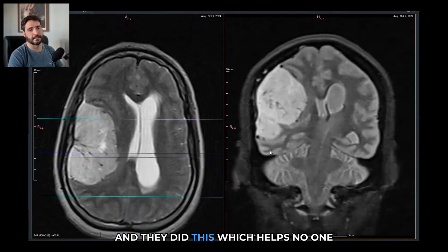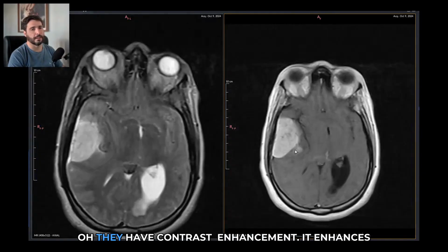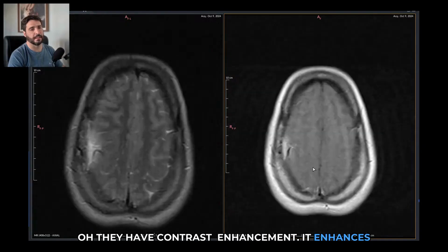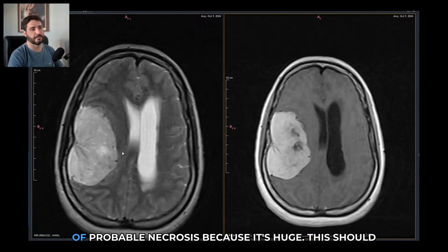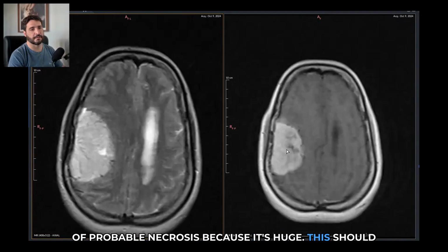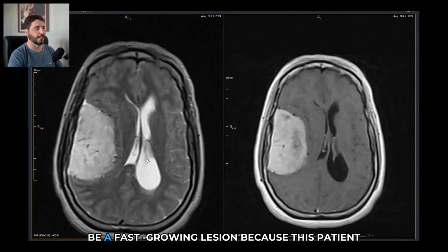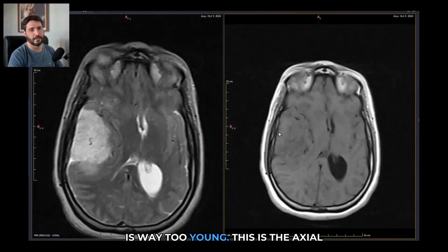And they did this, which helps no one. Oh, they have contrast enhancement. It enhances all over the place. It has some sites of probable necrosis because it's huge. This should be a fast-growing lesion because this patient is way too young.